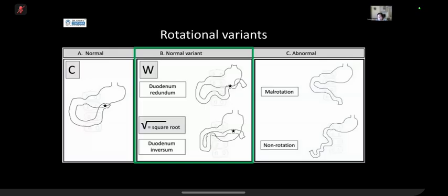To be fair, what you're going to see before that is a hyperperistaltic bowel or duodenum, with very little contrast coming through or very delayed passage of contrast. If you tell the surgeons that there is some sort of hold up of contrast at the duodenum where there's a transition point, I think that's good enough. They can go in intraoperatively to help out with it.